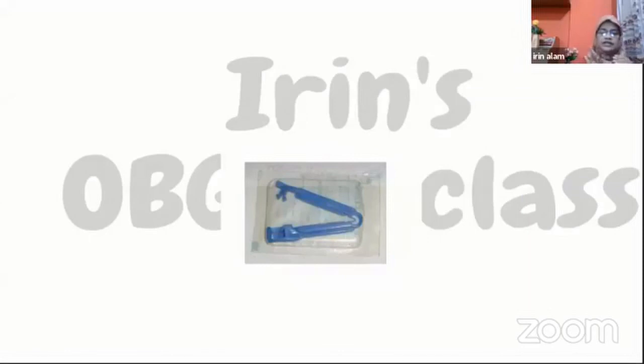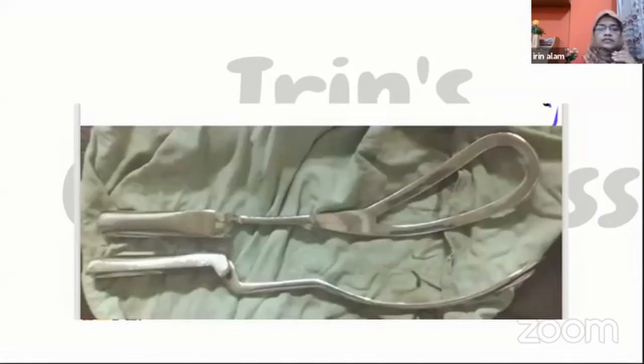This is the umbilical clamp, used to clamp the umbilical cord of the neonate. These are the forceps. During cesarean section, this is used. It acts as a vectis and helps to elevate the fetal head in case of floating head.